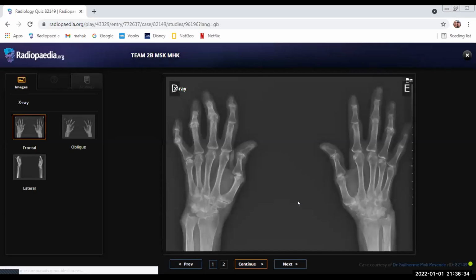It was actually rheumatoid arthritis. You described all the findings very well, but you can still add more, like there was soft tissue swelling. Yes, very right. And I always do this, I'm always busy describing the hand and I forget the radius and ulna. So don't forget to say you can see ulnar styloid erosions also. Yes, absolutely. You did very well in this case.